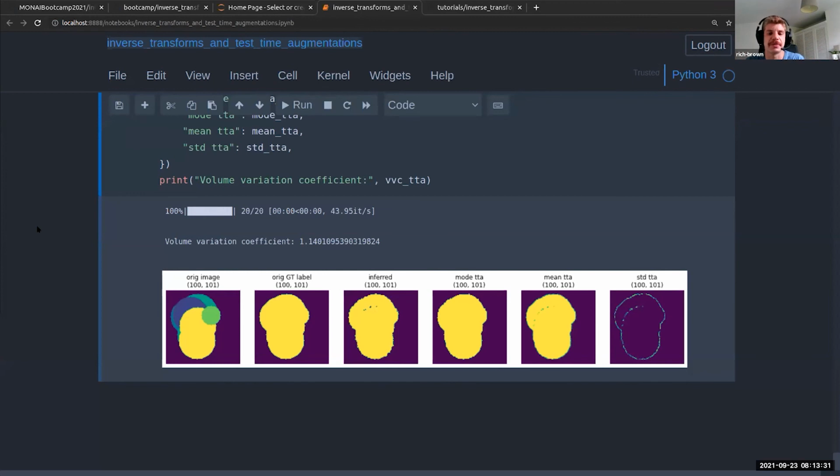And the reason I did that was because if I did minus 2 radians to plus 2 radians, then it could be a case where it was at 0 radians. And just for the case of this tutorial, that wouldn't be very illuminating. You wouldn't see anything being transformed. So this is a fairly artificial case, but I just wanted to do from 1 radian to 2 radians, so there would always be some sort of forward motion. So that's what the argument range X is doing, and that's why I used a set of arguments that you wouldn't really be using in the real world.